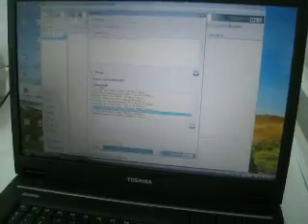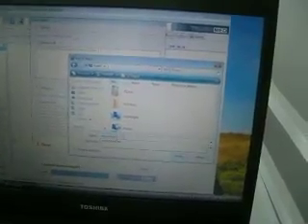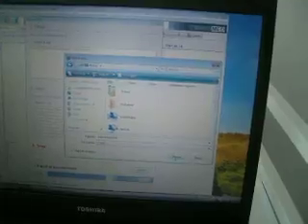of the selected patients. As a first step, you should select the user from which you would like to export the results. Then you should select some or even all of the patients under that user, and as a third step you can define a time range in which you are interested. Now I would like to export all the measurements of the selected patients. Now if I click export, it will generate a formatted text file. Now I put it onto the desktop.